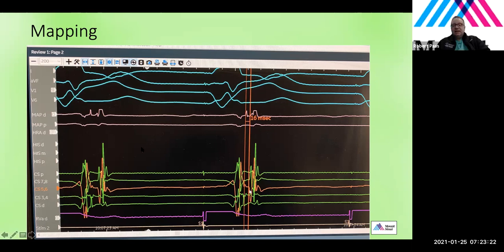But you are correct in asking the question, because it's certainly possible that what we're seeing here is up the pathway, but that it is not as pure up the pathway as if we were in actual ORT itself.